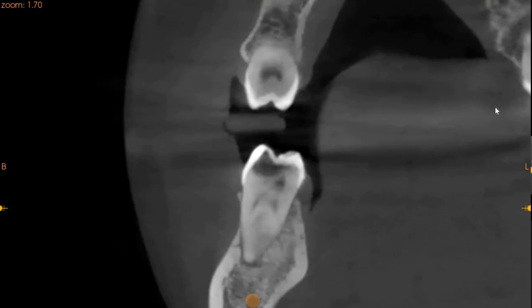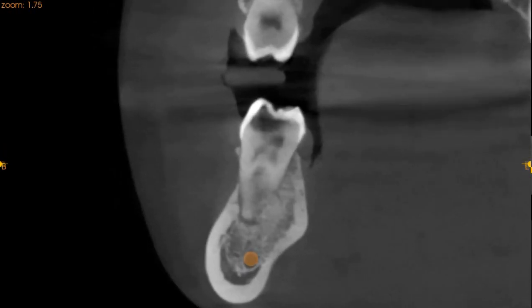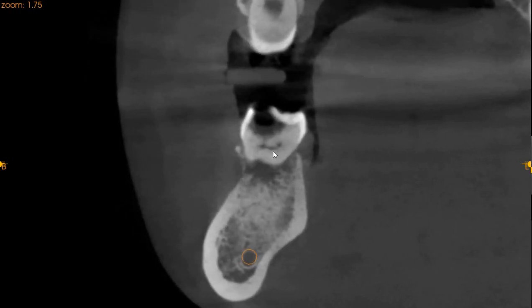On the transaxial view, which you can clearly see, this is the mesial root. On the mesial root, we've got two canals, and we don't see any major fractures or cracks in this case at the moment. Moving to the middle of the root, this is where the furcation is involved. We don't see anything major in the furcation other than this very faint line here.